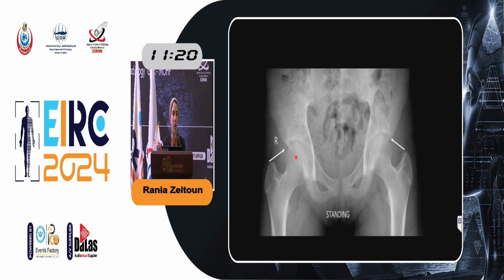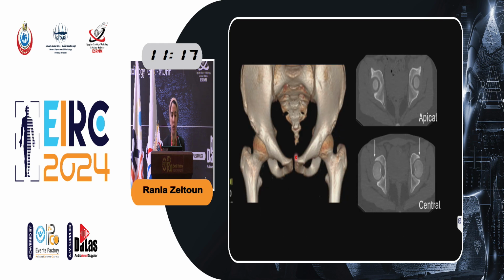But many times this is false positive in X-ray, so we need always to do a CT. And in the CT, we look at the 3D reconstruction images, and yes, they confirm the abnormality.